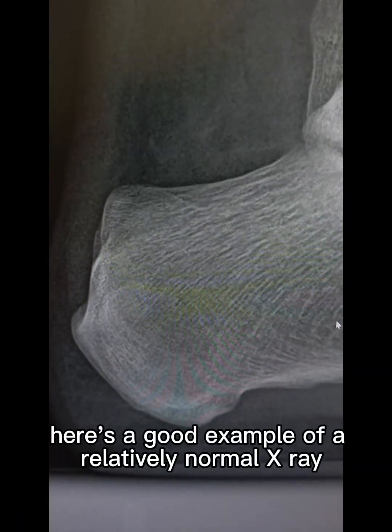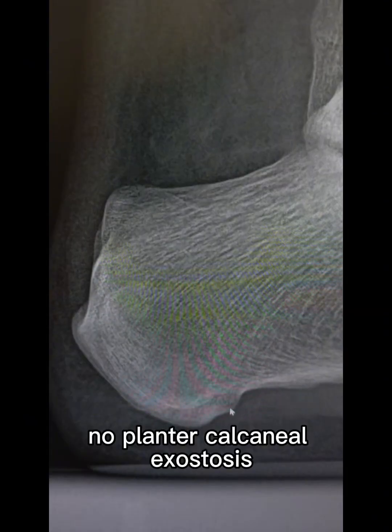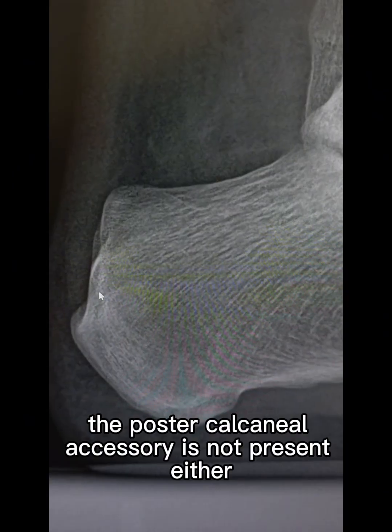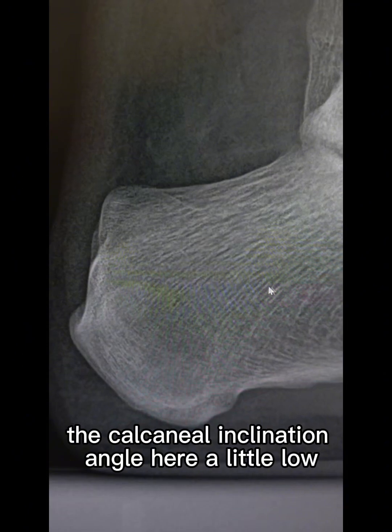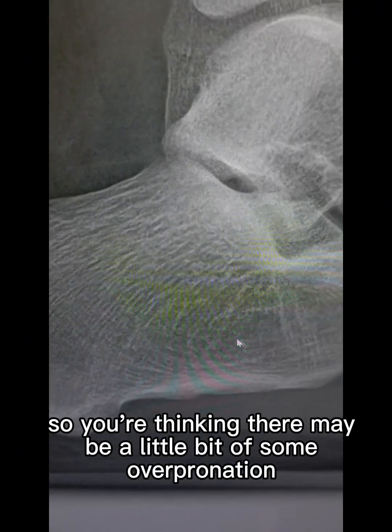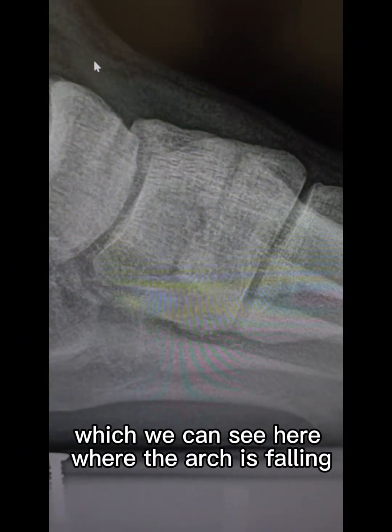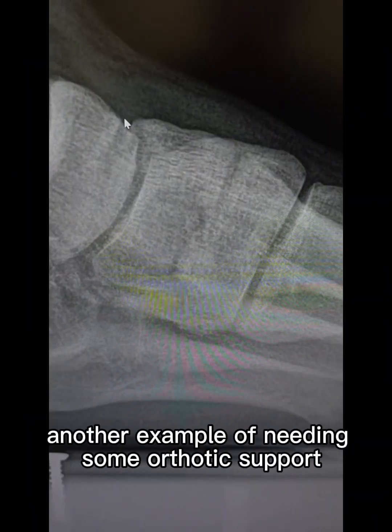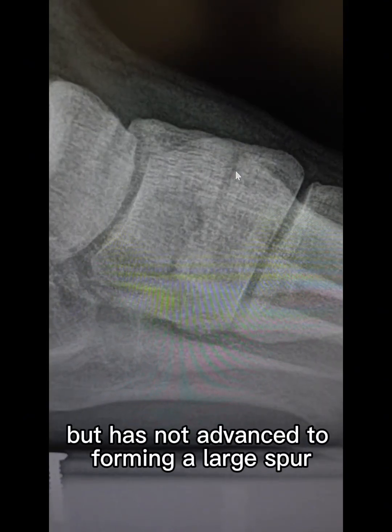Here's a good example of a relatively normal X-ray where there is no calcification here, no plantar calcaneal exostosis. The posterior calcaneal exostosis is not present either, so relatively normal here, normal contour of the bone, normal density of the bone. The calcaneal inclination angle here is a little low, so you're thinking there may be a little bit of overpronation and collapsing of the mid-tarsal arch, which we can see here where the arch is falling. Another example of needing some orthotic support, but has not advanced to forming a large spur.